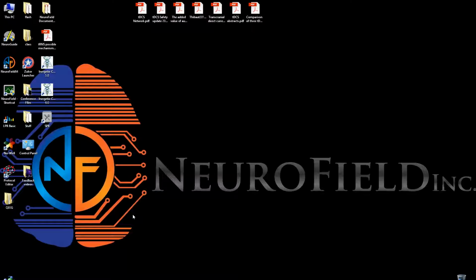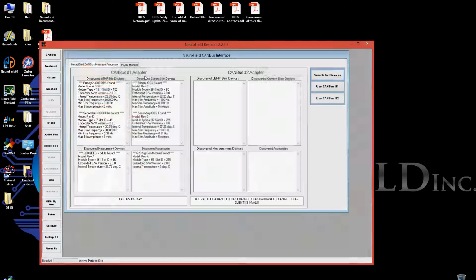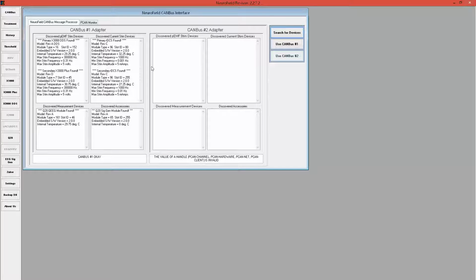Okay, I'm going to teach you how to do a Z-Score neurofeedback session with neurostimulation, how to set up thresholds, and use the Zukor media player as the feedback. So start NeuroField64, and this is based on beta version 2.2.7.2. Okay, as usual, when the program fires up, it's going to show you what's connected to the system.